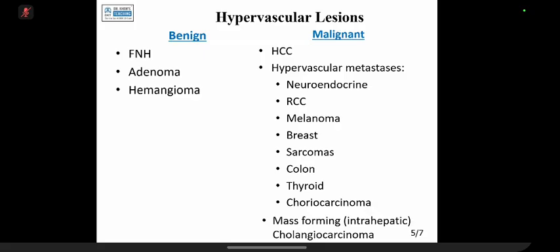We are always very interested in arterially enhancing lesions. They look very catchy. Wow, something is enhancing. Now, is it benign or malignant? So we will look for washout. If the washout is not there, we will call it benign. If there is washout, we call it malignant.